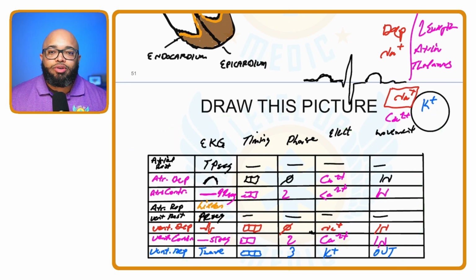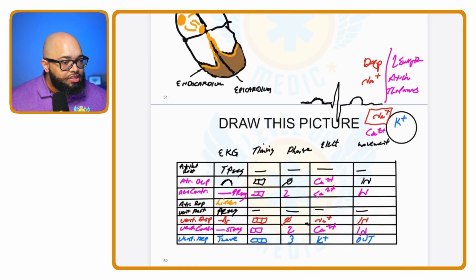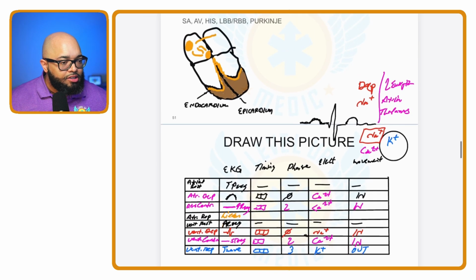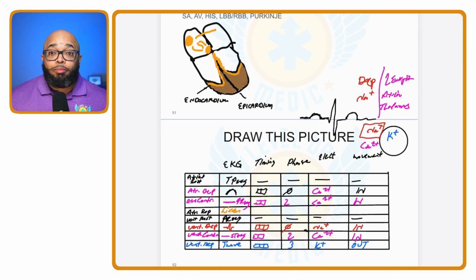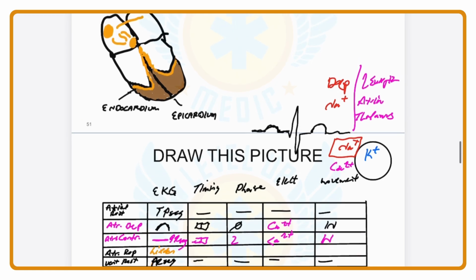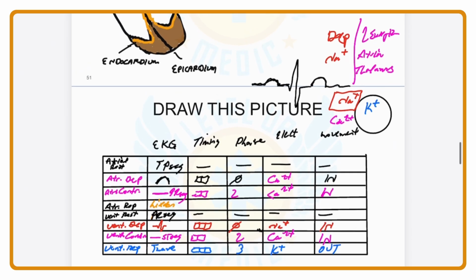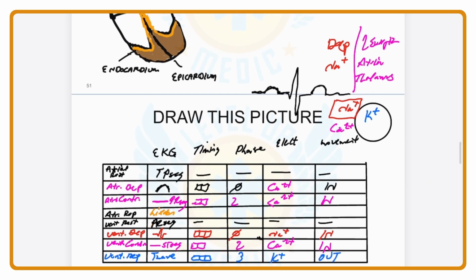Go ahead and take a picture of that. Let's make sure we got everything on the screen for you kind of nicely. Here, let me zoom out just a little to see if we can get all of that on the screen at once for one little picture. All right, go ahead and take a picture of that. Make sure you know it. In fact, let me just blow that up for you so you can just see. That's about the best I can do. All right, go ahead and take a picture of that quickly.